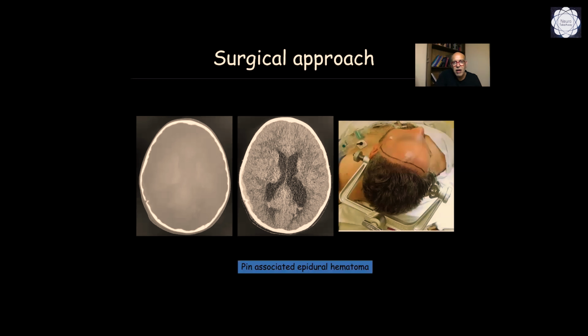Fortunately, another uncommon complication is those related to the placement of the pins of the frames, especially when the pins are not appropriate to the thickness of the skull of the patient. Sometimes this may produce these collections, epidural collections. In this case, it's very small, very thin, but sometimes I had the opportunity to see huge collections that had to be removed urgently.